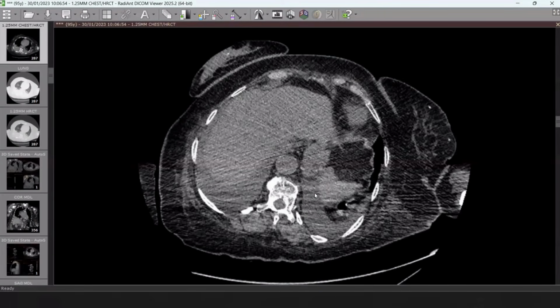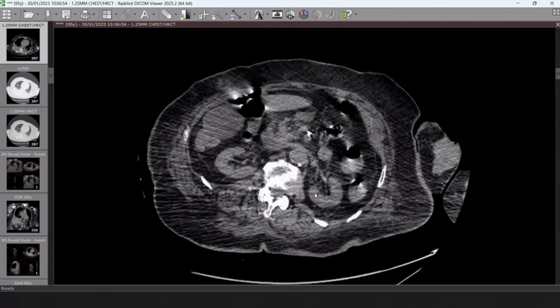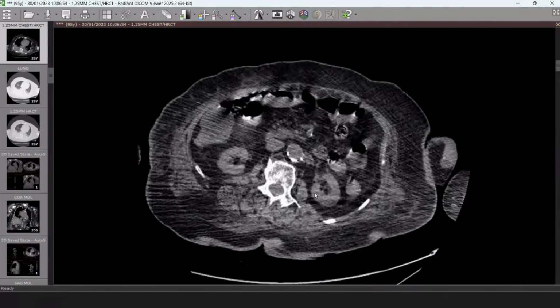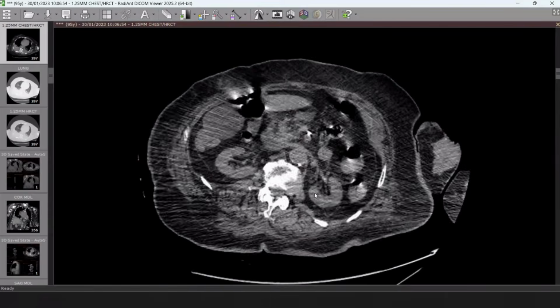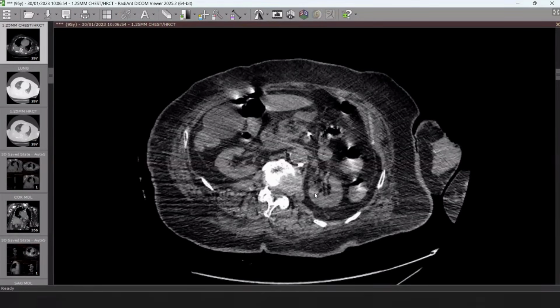What's your checklist? I'm just looking at the breast shadows, which I found is slightly asymmetric. And I will look at it; there is some soft tissue thickening around the left side.